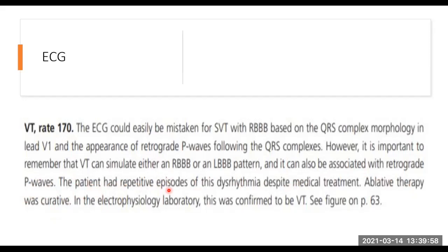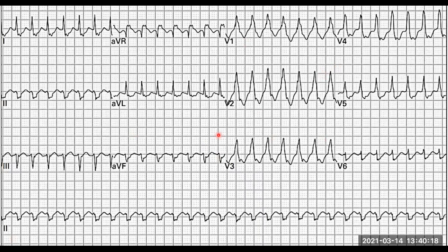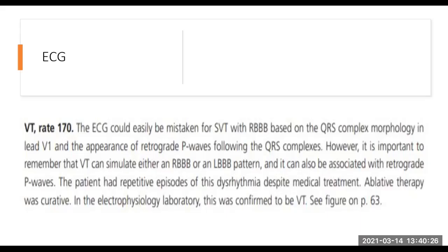Ventricular tachycardias can actually be quite difficult. However, it depends on the underlying cause as well. Now, the thing is, I don't want you guys to stress right now about what we call aberrancy, which we'll get to later on. The truth is that from all of the ECGs that you see that look like ventricular tachycardia, 95% of them are ventricular tachycardia, and 5% are where you have an SVT with a bundle branch block, and that's why it creates that. So don't stress about that.